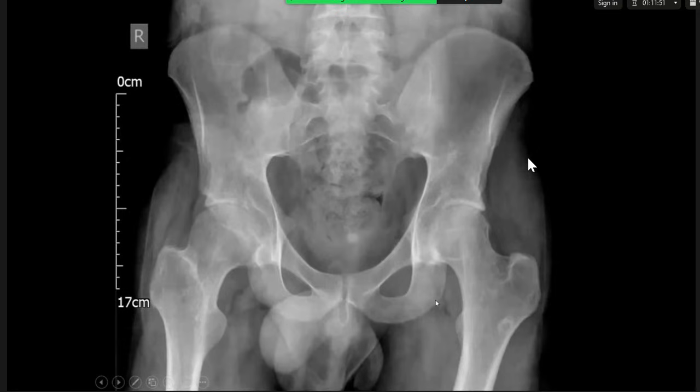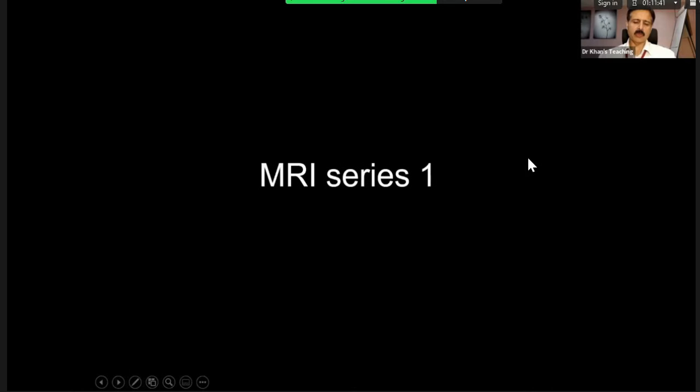So given that the patient has diarrhea and bilateral sacroiliitis, my concern would be that the patient may have an inflammatory bowel disease such as Crohn's disease. Okay, so we did an MR for the patient. Can you scroll through, give me your findings, please?